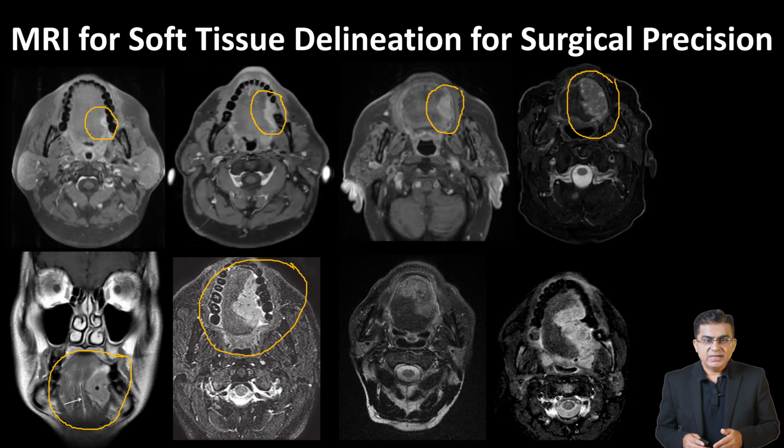Patient 7, bottom middle. He has a massive tumor that frankly crosses the midline septum anteriorly. It involves the deep muscles and the floor of mouth. He will require a subtotal glossectomy. The surgeon will remove the entire left half and a big portion of right half of tongue along with the involved floor of mouth. A free flap reconstruction like an anterolateral thigh flap is absolutely mandatory here to restore function.